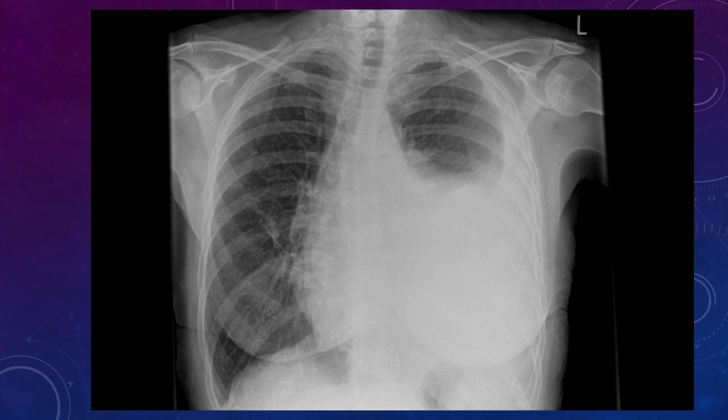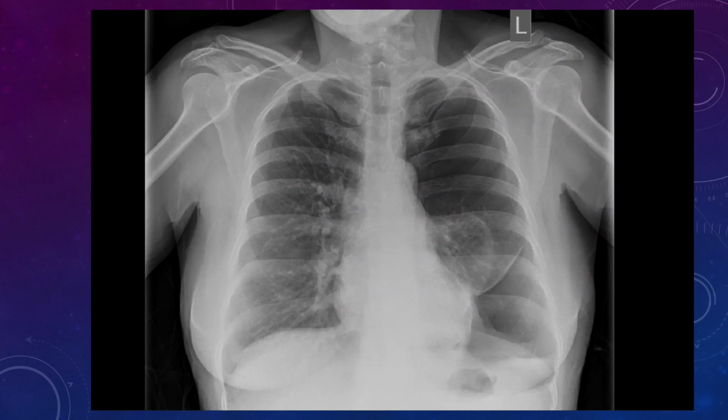So tracheal position will tell you whether it's being pushed or pulled, whether it's consolidation and collapse, or it's effusion, which is pushing it over. And these are the subtle signs. Okay, how about this one?